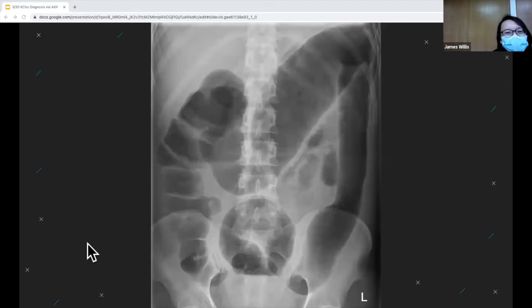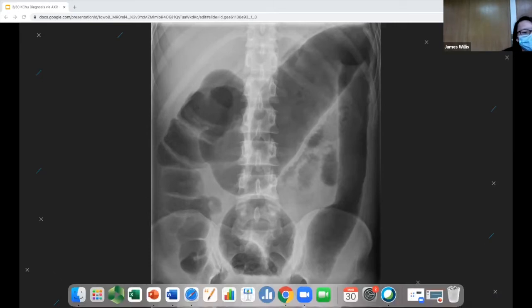Okay. JMac. They have dilated large bowel. Yeah, so all the large bowel is involved. And let's say I said this patient had diarrhea that was very watery, fever, and recent antibiotic use. Exactly. This is toxic megacolon. Great.